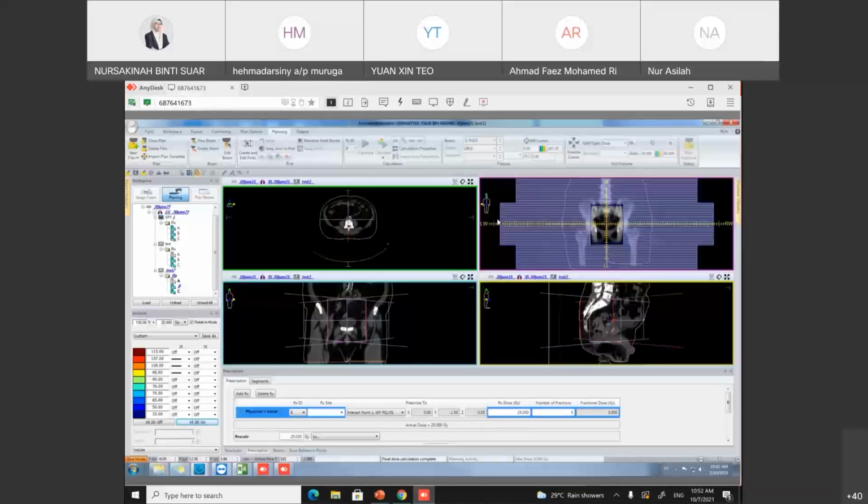So you will need to read which area you want to cover, meaning the superior border and the inferior border where you should cover, but I'm not going to explain this in detail here. You may find it in the treatment planning books. But I'm sure when you work as a physicist, your senior will teach you.